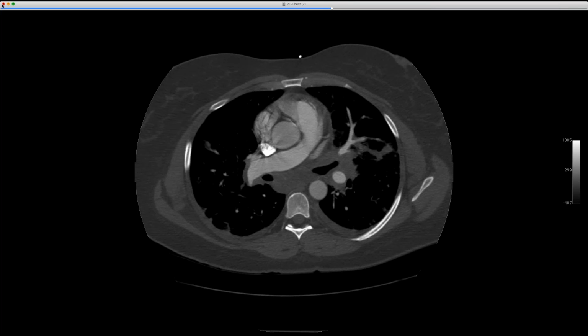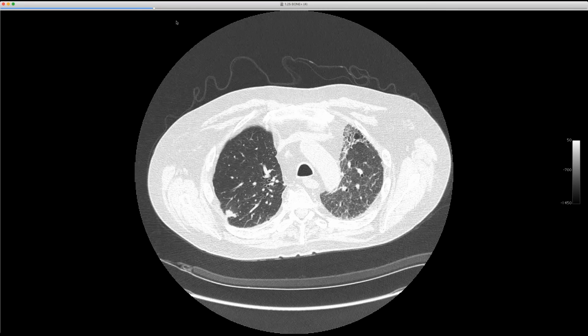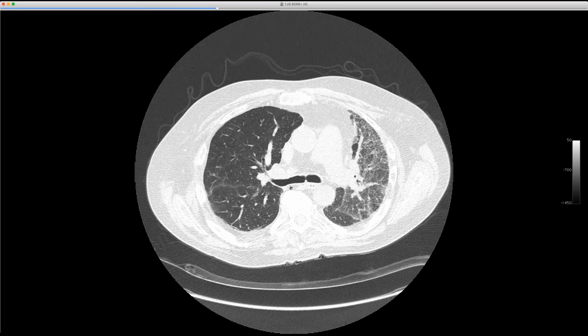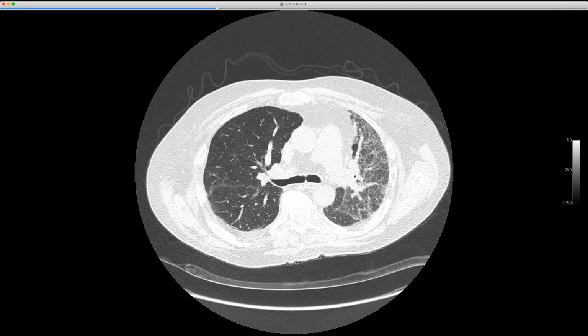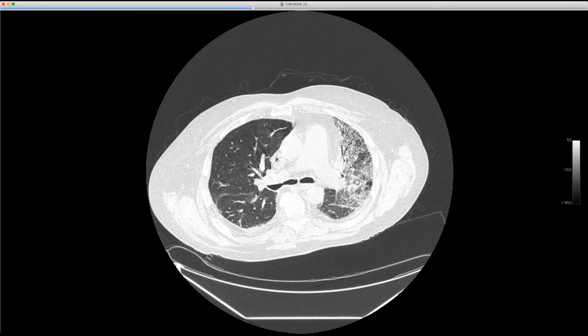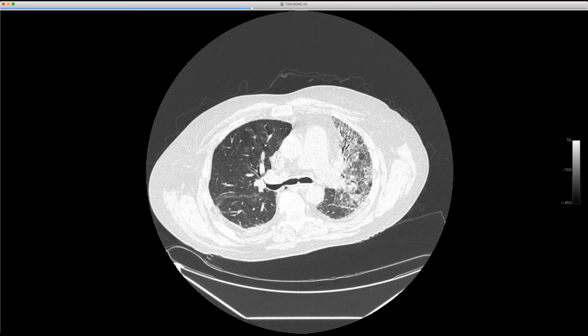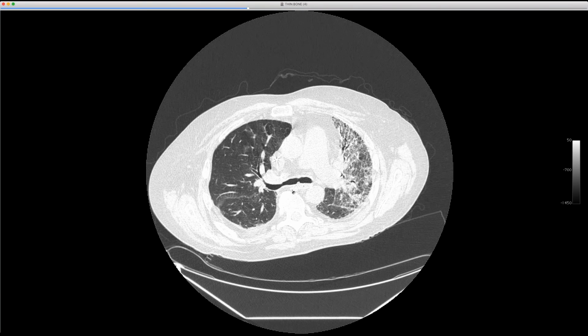Okay, well, here's an airway case that was kind of a neat case. Let me show you guys. This is a patient who had a lung transplant, solitary lung transplant for fibrosis. This is back in October, and you can see the bronchial anastomosis looks very happy. No stenosis, typical appearance. Patient was having some spirometry issues, and so we did a CT scan later. So this is now December, and you can see it's narrowed. And if you throw it on a coronal, you can see it's quite striking, but it's cut down by about 50% at the anastomosis. Nothing really else.